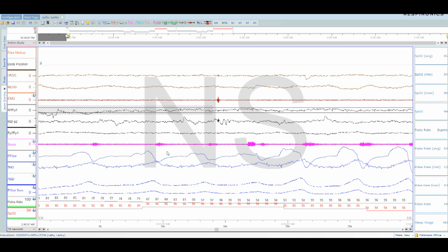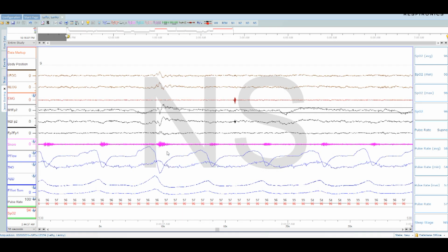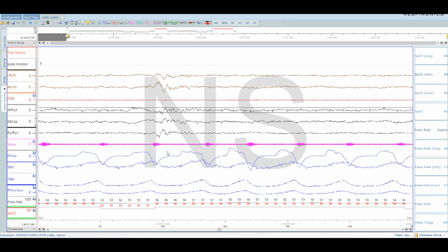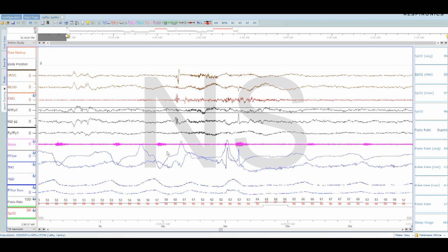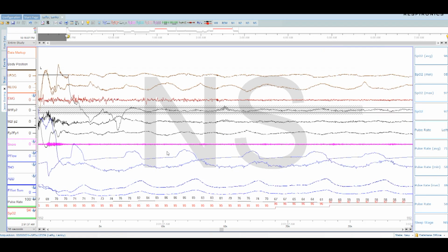So we have a big arousal there. Back to sleep. I assume it's REM, but I'm going to go with stage 1 just in case. Yeah, I'm glad. Stage 1, now that's stage 2. There's a K complex, so 2, 2, 2. So maybe that was an arousal, and I did get lifted out of REM. So we have another arousal there, I don't know why. I'll figure that out later. And stage 2 still, we have an arousal at the end. So this is 2 with an arousal, so we're going to reset.